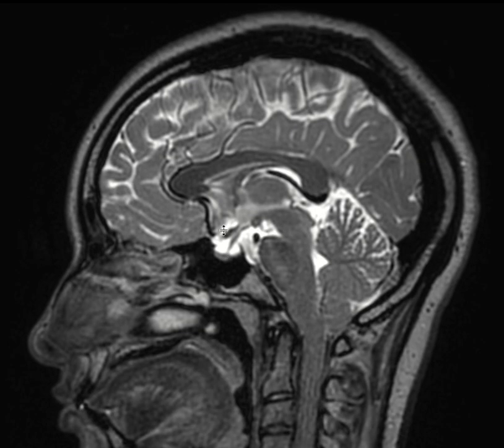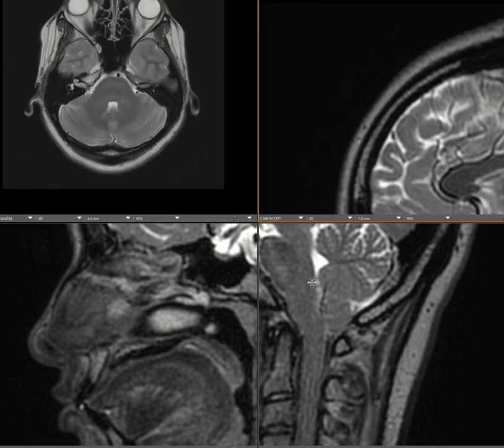axial. So the partially empty appearance in a patient around 20s is just not a very normal finding. We see cerebellar ectopia. You see that the cerebellar tonsils are herniating through the foramen magnum, and basically this is cerebellar tonsillar ectopia, which is acquired in these patients with IIH.